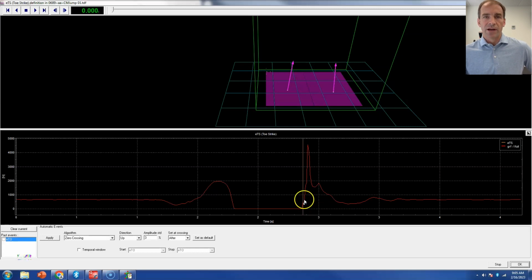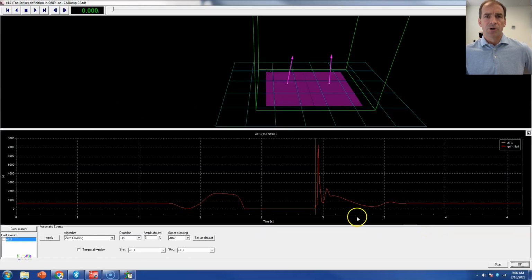So I'm going to right click on the orange line. That's now going to remove that marker. I'm going to move it where I want it, barely, just a little bit. That now becomes blue, but if I move this scrubber up top of the screen here, you'll notice that it's become orange. Basically what I've done is I've created a new marker. So now this becomes the toe strike, and I'm okay with that. It's a little more accurate than what was previously there. So we'll hit OK and go to our next one.